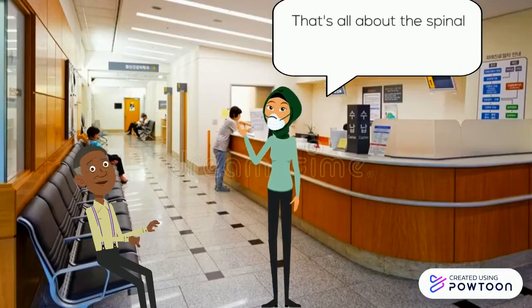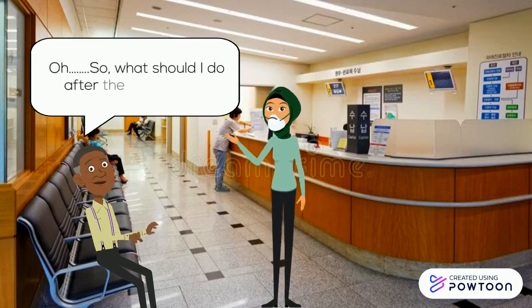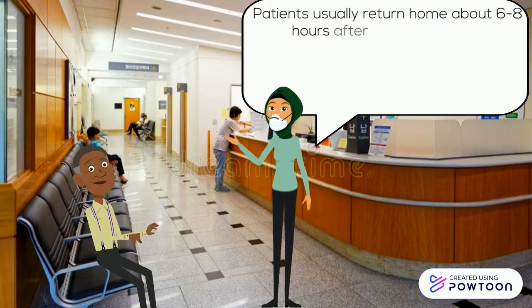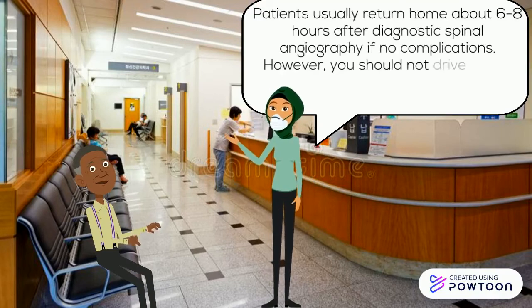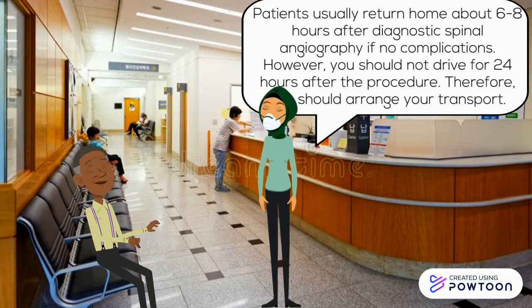That's all about the spinal digital subtraction angiography procedure that you will be undergoing, Mr. Lee. Oh, so, what should I do after the procedure? Patients usually return home about 6 to 8 hours after diagnostic spinal angiography if no complications. However, you should not drive for 24 hours after the procedure. Therefore, you should arrange your transport.